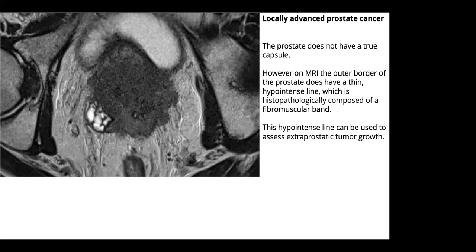So the visualized portion of the prostate gland on this section is entirely replaced by abnormal signal with this lobulated, indistinct appearance. This is a locally advanced lesion, which is infiltrating the paraprostatic fat, extending beyond the capsule, infiltrating the seminal vesicle and extending into the mesorectum as well.